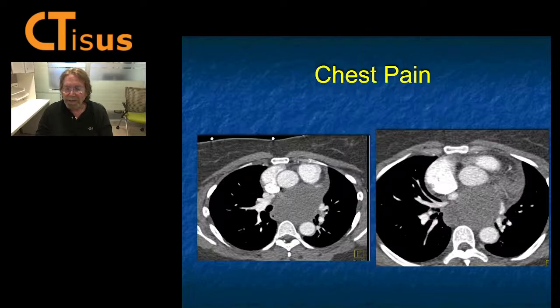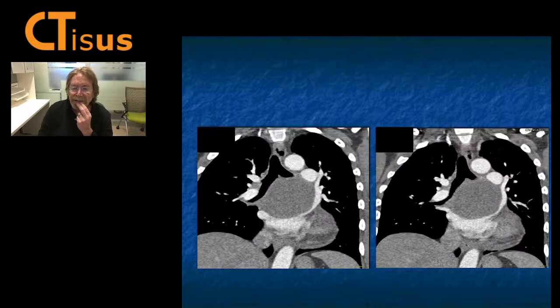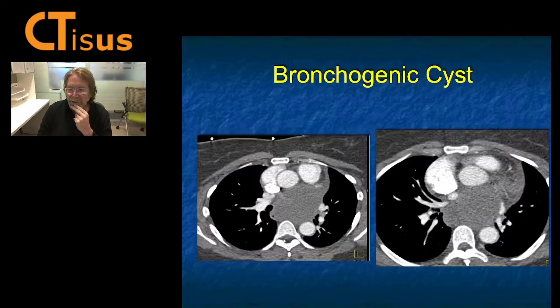I'll give you two cases. Cystic lesion, middle posterior mediastinum. Water density, displacing structures. You can think about malignancy, but it's water density and displacing. When you see water density, I'm thinking about cyst, duplication cyst, neuroenteric cyst, esophageal, bronchogenic cyst. Bronchogenic is the winner. Water density, they can be large.